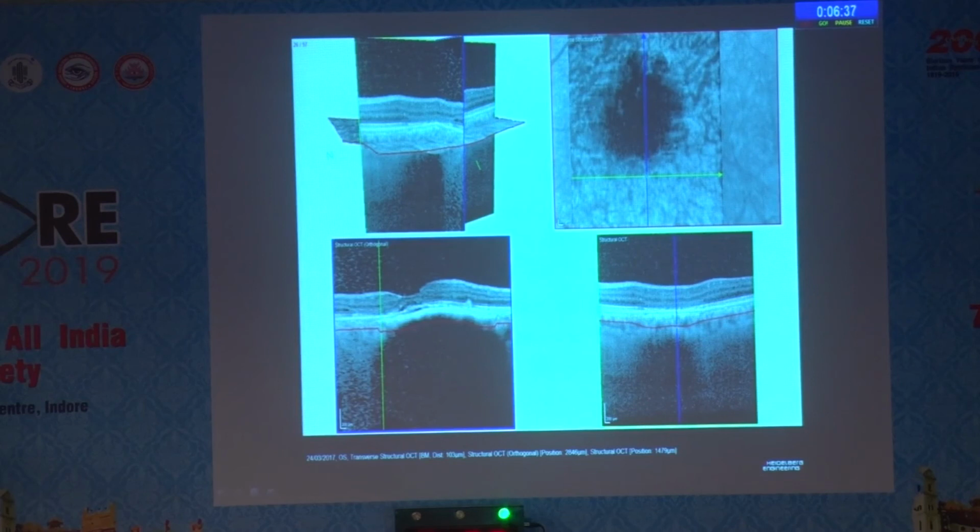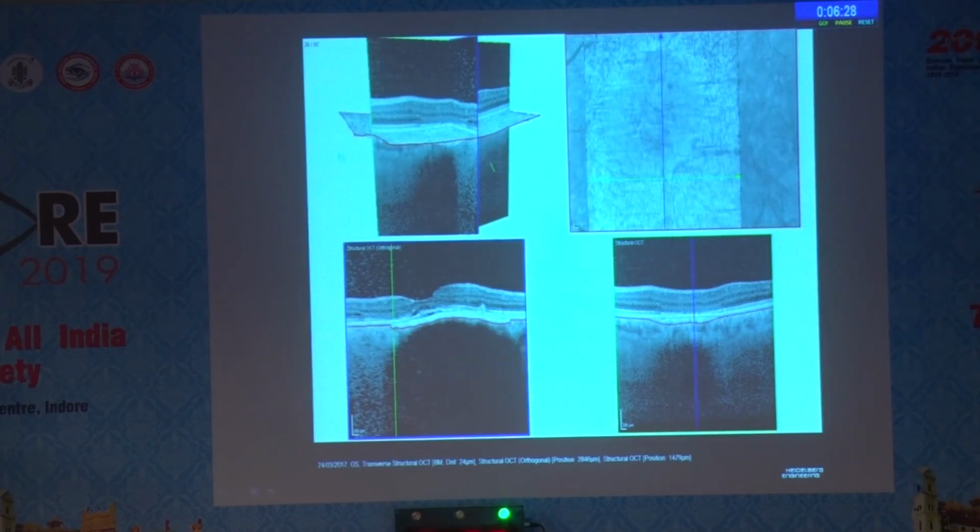But this is why this is not leaking on the angiogram. I would like to see the fluorescein to see if there are leakages. Unfortunately, we're doing only advanced imaging today. So no. Okay. Old is gold. Old is gold. Okay, I think that's it. The FFA doesn't show anything much.